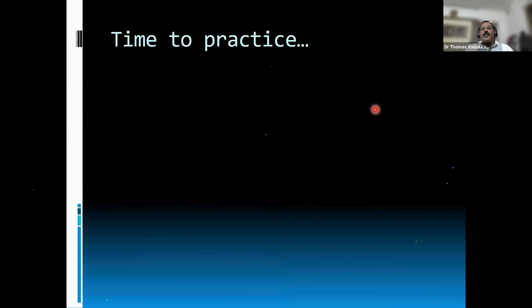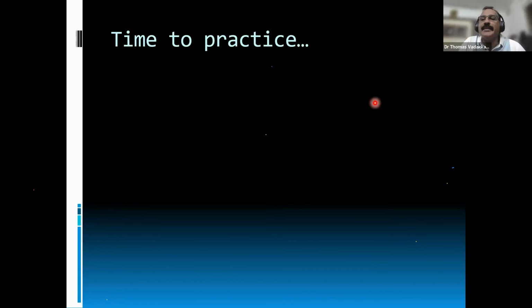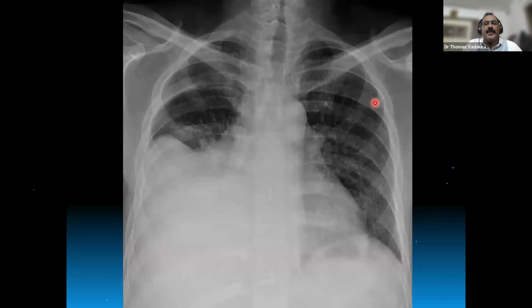I think, am I audible? Yes, sir. Now I will show some X-rays. Some of you can volunteer and diagnose it. It's not a very complicated X-ray, simple X-rays which you are seeing in your day-to-day practice. Can anyone tell what it is?